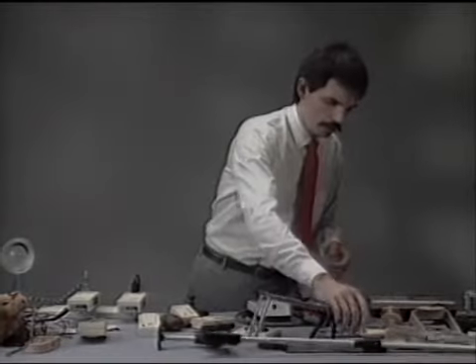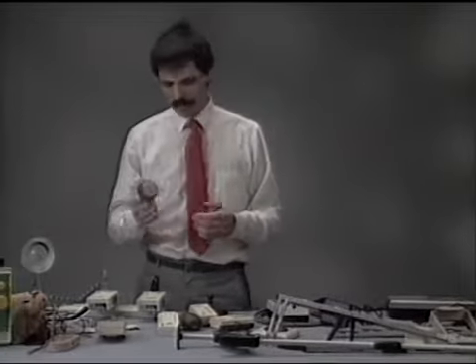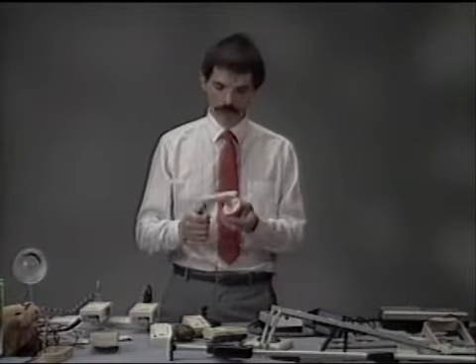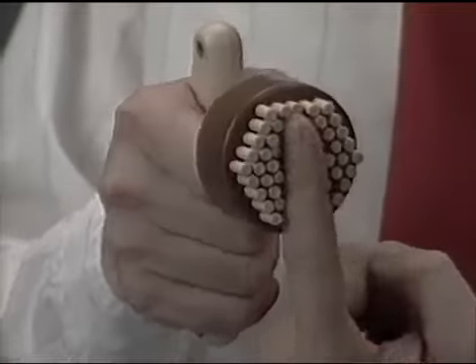Moving on from reachers, we look at things like knob turners. Now, a knob turner is a great device. If you have washing machines, dishwashers, kitchen stoves, all those things that you operate that have knobs, for some people that's very tough to operate. And what we want to be able to do is build up those handles, allow those handles to be a little bit longer and easier to operate.